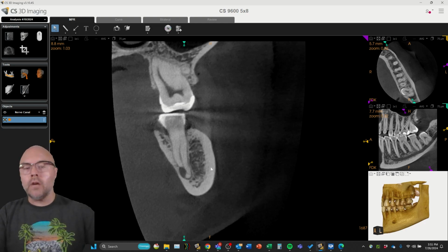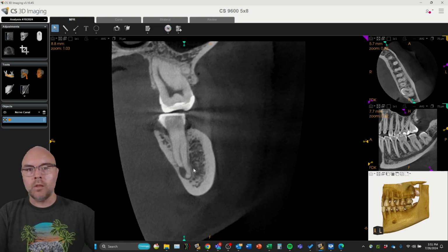Or if you're a Carestream Dental CS Imaging 8 customer, then this nests right into your imaging software and becomes part of the documentation and the rest of the imaging records that you've got there. It's really cool. So keep in mind that camera button right there is there, and it's a really good tool for documenting just about everything that you see in these CBCT scans.